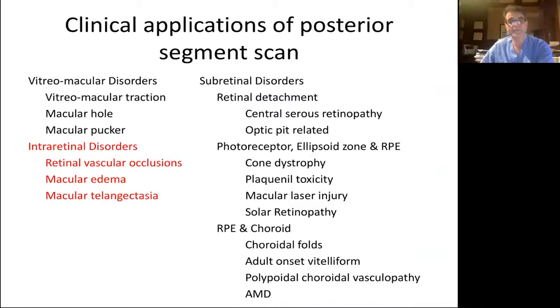So that covers vitreomacular disorders and some of the more common OCT findings with these disorders. Next, I'm going to talk about intraretinal disorders.